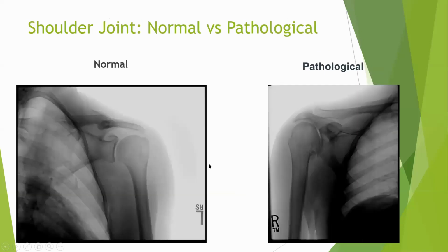Okay. All right. So we were talking about the shoulder joint and why the shoulder joint X-ray is different than this one, because this is video fluoroscopy. It's a digital form of X-ray, and a digital form of X-ray gives very crisp, clear borders, a very nice way of analyzing and evaluating bone edges and whether soft tissues are present or not. You can even check these lung areas where air is not going. There is not much perfusion going on within the lungs. That's why it's so dark right over here, and that's why it's so white right over here. You can also notice the beautiful rib cage right over here. And this is the normal condition.